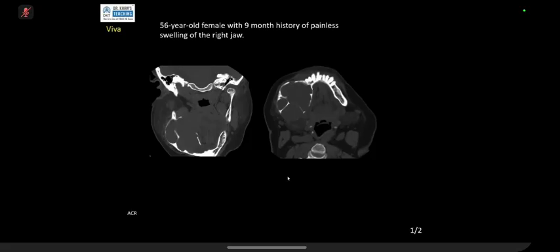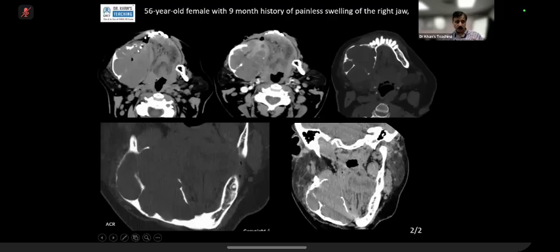So this is likely suggestive of a non-aggressive etiology, a likely ameloblastoma. Next, I would like to view the soft tissue window as well, and would inform the dental surgeons, head and neck surgeons, maxillofacial surgeons for further evaluation. So if we see here, there are internal septations, and this is the soft tissue. This is the post-contrast soft tissue. What do you think? What is your final conclusion?